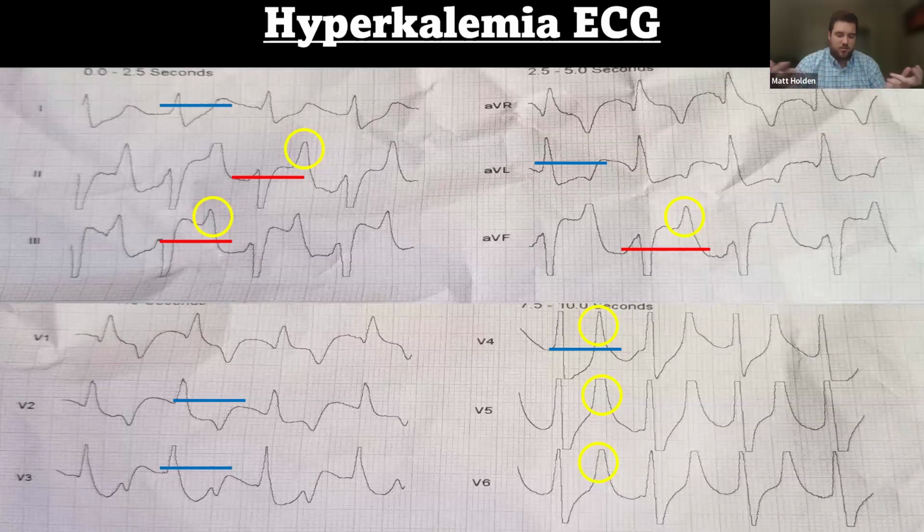I like to think of this, and I was always taught, you don't want to ever sit on these T waves because they're going to hurt your butt. They're nice and pointy, and they hurt. So this is going to be hyperkalemia, once again mimicking a STEMI. Yep, KJ, pointed with your booty.